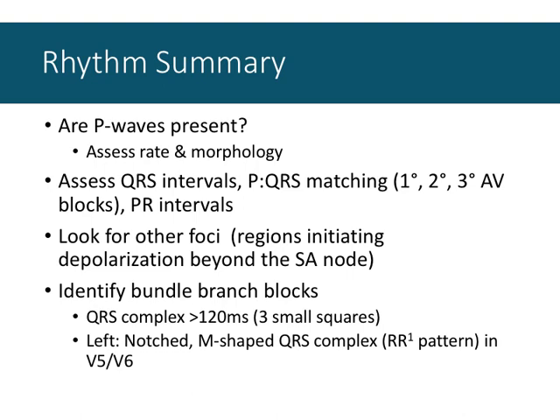So you're looking at the width of the QRS complex. Is it always wide? Is it sometimes wide? Is there a premature ventricular contraction that just happened and we were lucky enough to catch it while they were sitting connected to the 12-lead ECG? Or is it a more regular, longer, drawn-out delay that's indicative of some kind of blockage of the AV node or below?